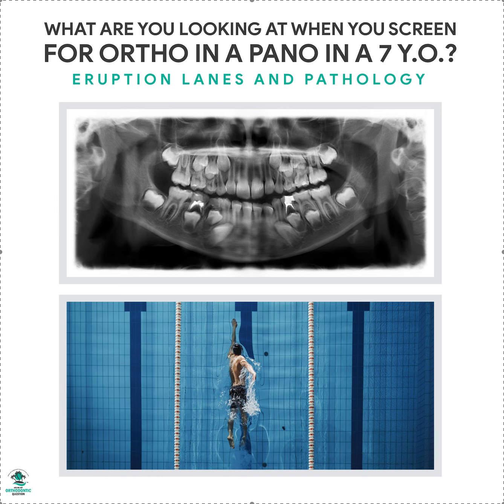Straightsmilesolutions.com, and one of the questions that came in today is, what am I looking at when I screen for ortho in a Pano or an OPG in a 6, 7, or 8-year-old? And I thought I'd just give you an example.